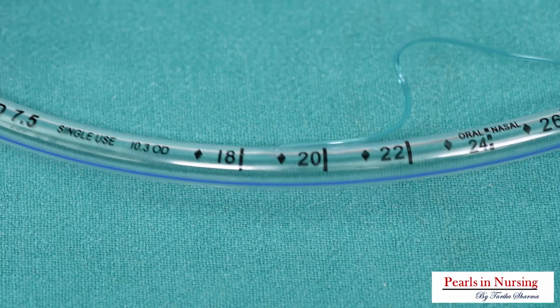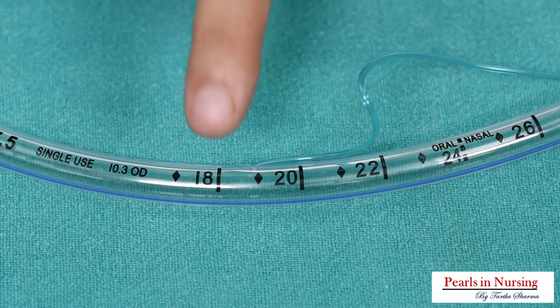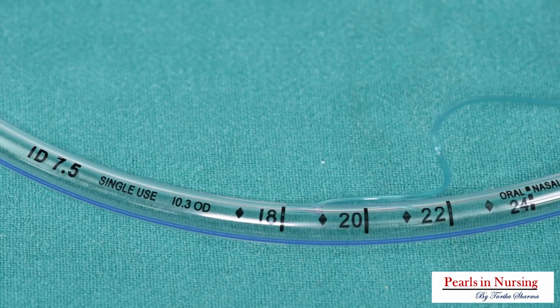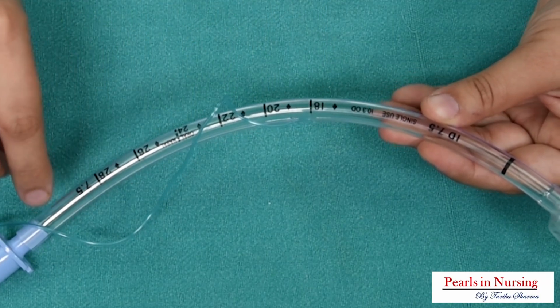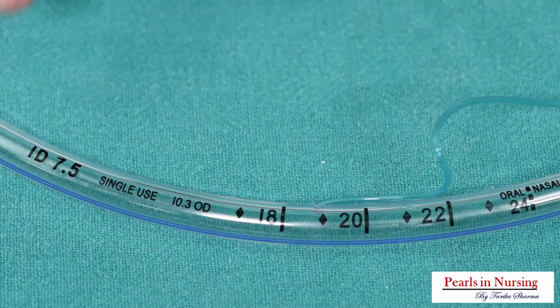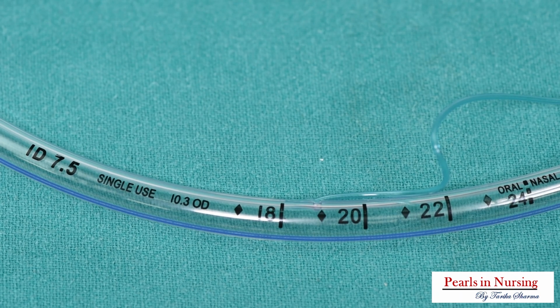Then this is the tube where you have different kinds of markings. This blue line is the radio opaque line, which will help to see the position of the tube in the trachea. And then we have different sizes, like you can see this 18, 20, 22, 24, that is the depth. And this size is in centimeters. And you have also written here ID 7.5. It is the internal diameter of the tube, which is 7.5.